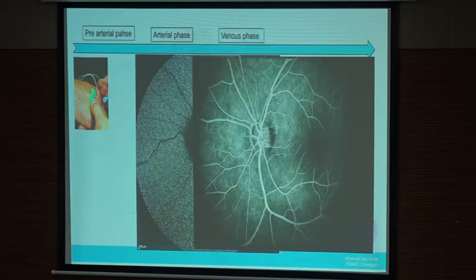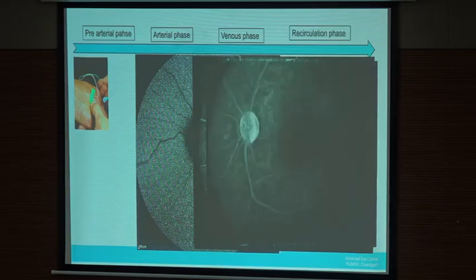The venous phase is divided, if you read the theory, into early, mid and late. This is what early is. You see that classical laminar flow. You should read the theory yourself. But this is happening in 2 seconds. So 13 seconds in the artery, another, there's a range, 15 seconds, another 17 seconds in the vein, and then it goes into the recirculation phase. That means the artery and vein are constantly washing out to the heart and back, and after a few minutes it will wash out.